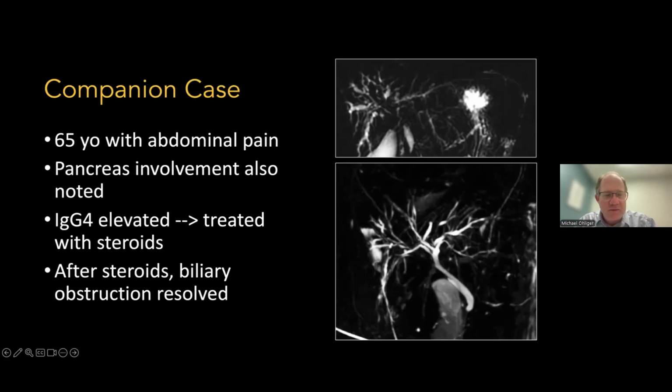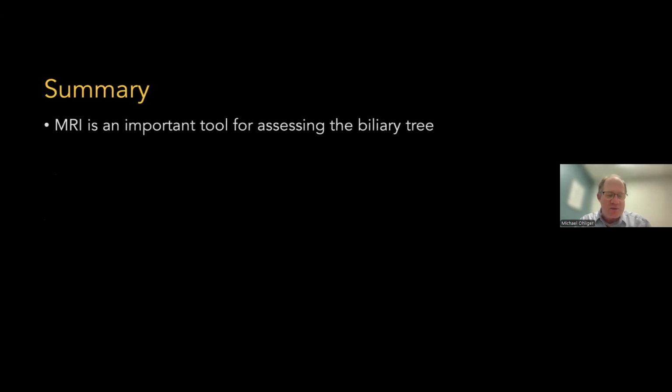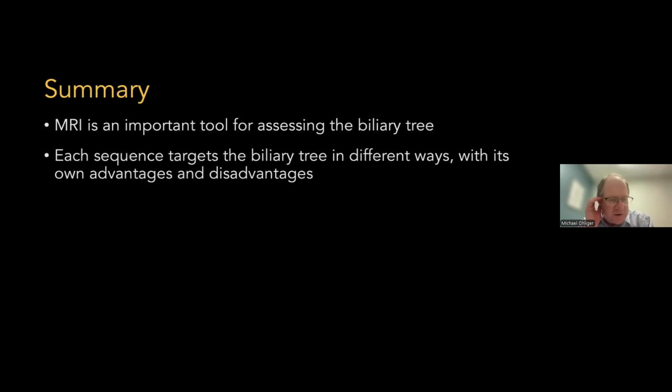So that was about all the examples I had. Of course, there's a lot more that we can talk about in terms of looking at the biliary tree and MRI and other things. And of course, given the opportunity, I'll go on forever. But it is an important tool, and it's really something nice that we have that produces really nice images when we get really nice images. But we can do something without giving contrast, very non-invasively, and we can see it.